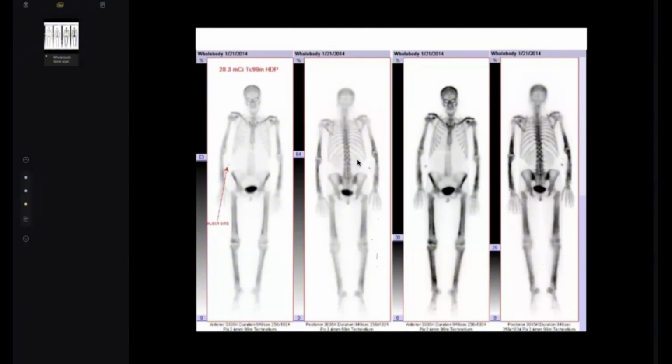One colleague asked about the super scan in hypertrophic osteoarthropathy. I think here the kidney is at least faint, and here it is clear. How do we differentiate between both of them? Number one, by history. Number two, X-ray. Number three, in this isotopic scan. Look here, it looks similar, by the way. I agree with you, but at least there is no super scan.